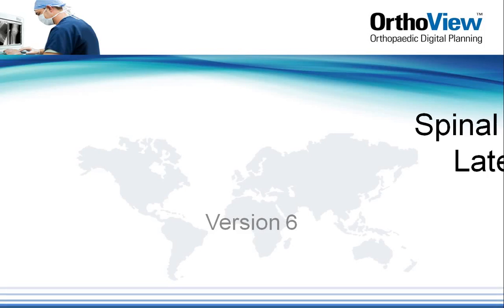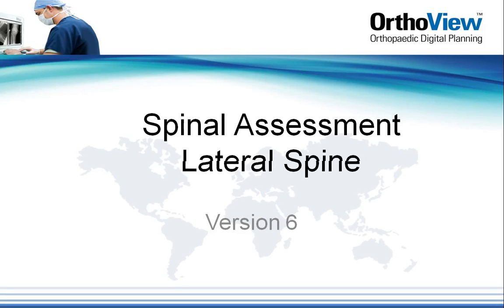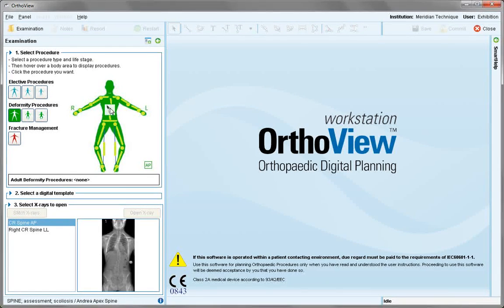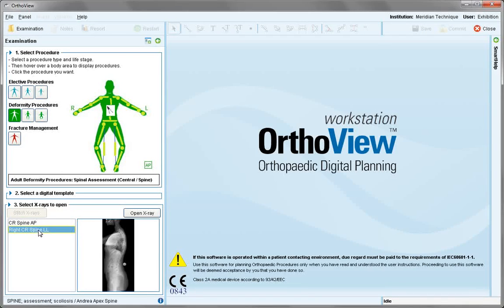This tutorial reviews the wizards available for assessment in the lateral spine view. Choose procedure as deformity procedure, move over the spine and choose the spine assessment icon. No templates are shown and the AP or lateral or both images can be opened.